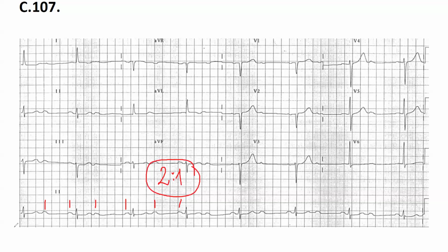All right. Let's see the width of the QRS. Looks normal. Okay, so that means there are no intraventricular conduction abnormalities. Next, the ST-T, but everything is fine. Good. All right. Let's move on.